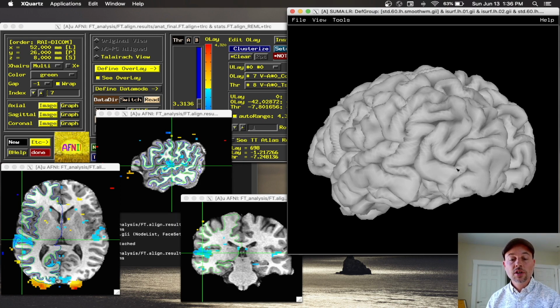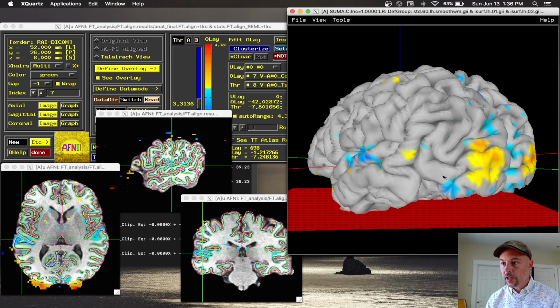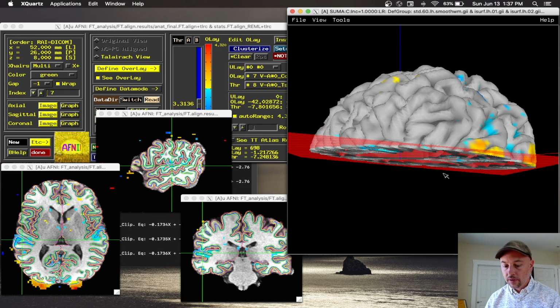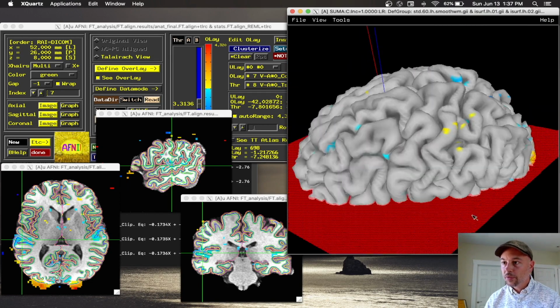If I start the GUIs talking, SUMA sends the surfaces to AFNI, and AFNI sends the stats to SUMA. Starting SUMA's clipping plane mode, a clipping plane is created, which I can move, rotate and tilt. I can move the whole brain, and you can see into the cortical ribbon, turning it off and on. Up to 6 of these can be made.